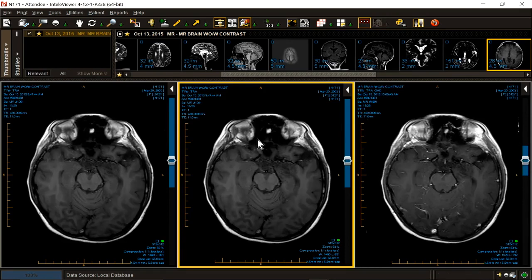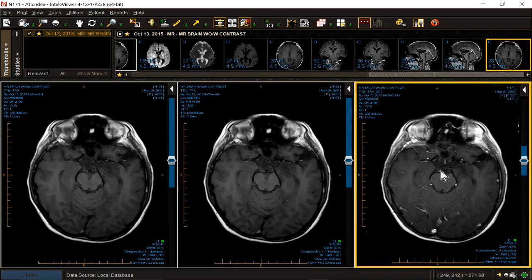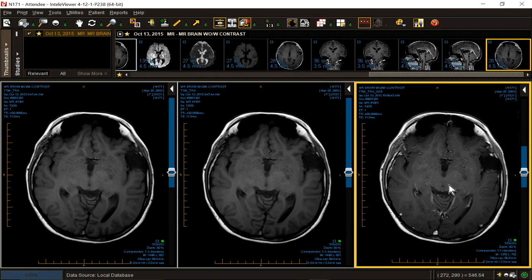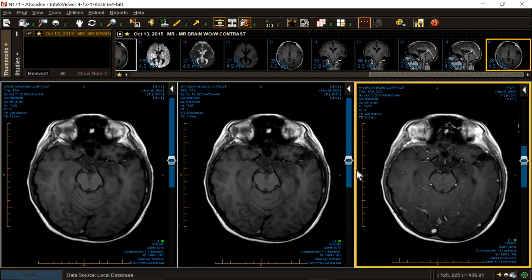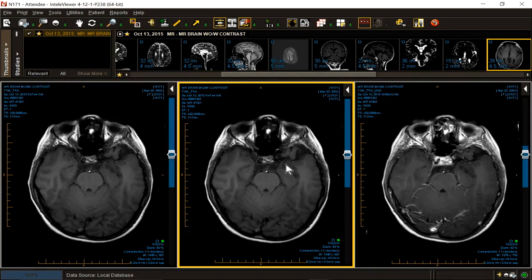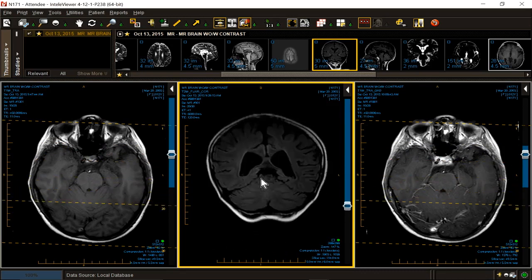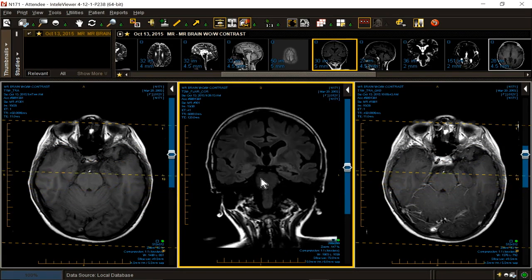Location, temporal. Zone of transition, intermediate. Blood, none. Fat, none. Mass effect, mild blunting of the right cerebral peduncle. Intraaxial, for sure. Adjacent anomalies, perhaps arachnoid cyst in the Sylvian fissure. And the amount of sulcation is in question overlying the lesion. Let's see if we can do a better job at assessing that. Difficult with the mass effect. So I'd have to say questionable.